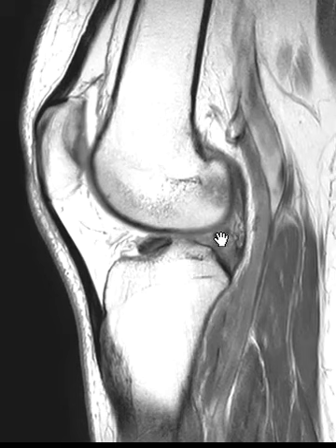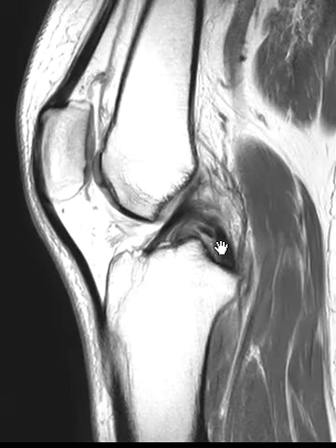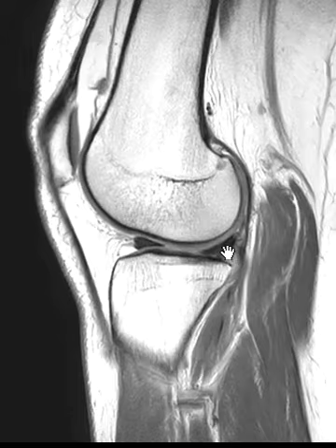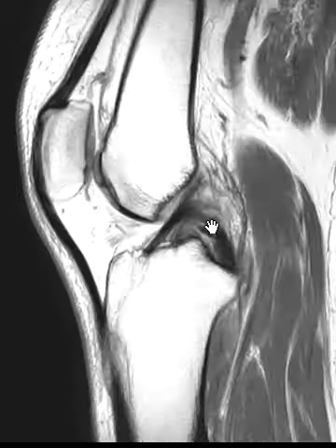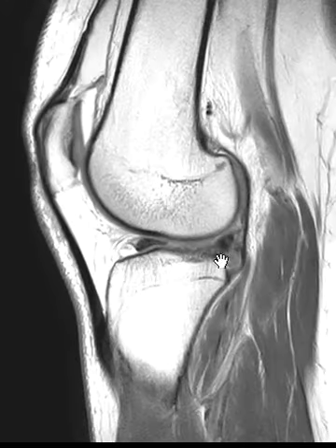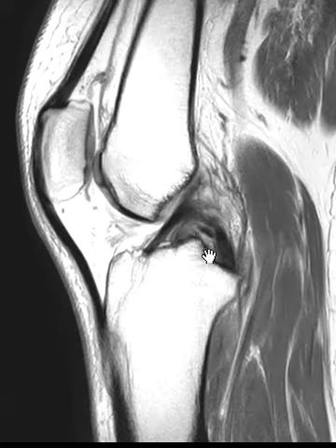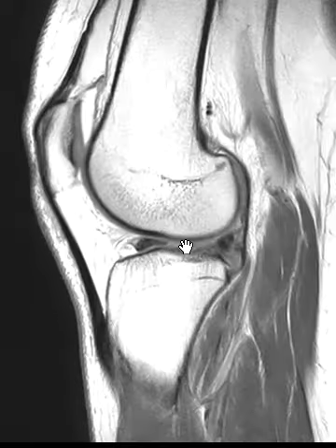We see something back here. This thing in back is the meniscofemoral ligament of Humphrey. It goes in front of the PCL, comes off the posterior horn here, and it goes across sideways. It attaches close to the PCL here. And that's intact, so that's holding on, but the meniscus root, which should be right there, is absent. And right here you can start to see some thickness. So this is the part that attaches to bone, right there, that little bit of fog. So a torn lateral meniscus root.